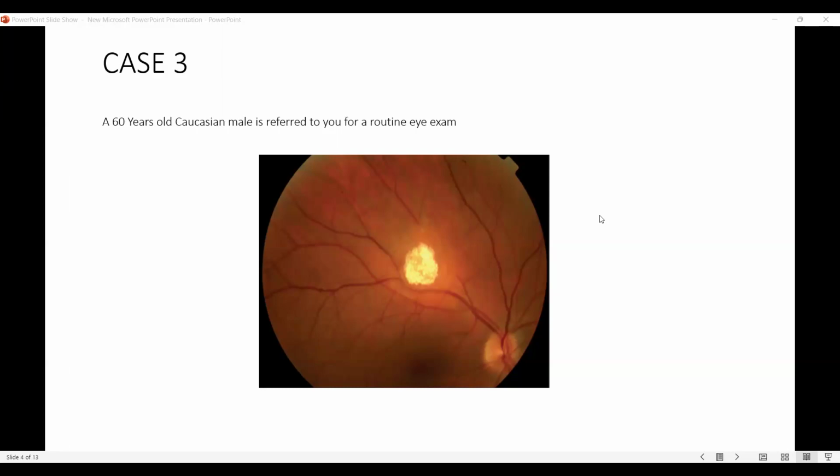In a case of trauma, there would be a clear history of some foreign object going into the eye, or some trauma sustained in the past or in the near time, but there would be other signs also. This looks like a relatively quiet retina, and just a focal lesion is there.